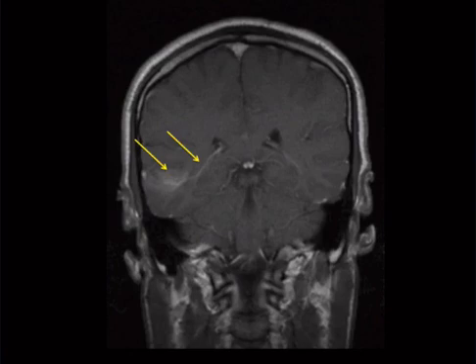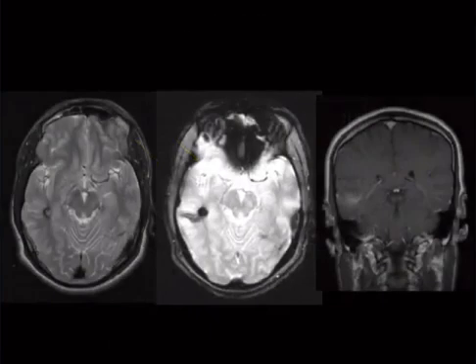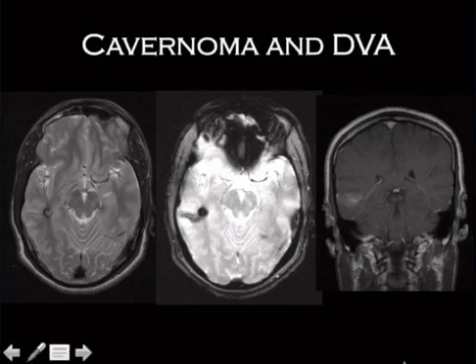So when you see this, this is the peanut butter. Then you have to look for the jelly. All right, so here comes the jelly. See this right here, hemosiderin sequence? What were the 3 reasons you see hemosiderin sequence? Amyloid, cavernoma, and to prove or disprove the presence of blood, right? So this is the cavernoma case.